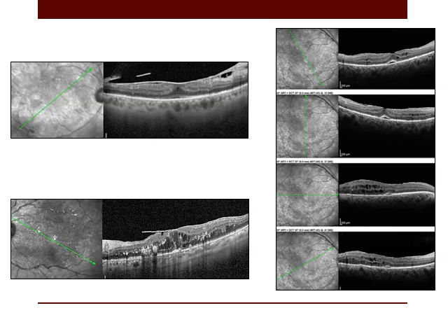In this patient, the common question is: is this tangential traction the cause of the spongy thickening or the diabetic changes? The answer is simple. Look at all layers of the retina. If they are equally thickened, not only the outer plexiform layer as we see in diabetes, or not markedly the outer plexiform layer as we see in diabetes, there is a tangential thickening and not vascular thickening. As you can see, here is thickening, thickening, thickening.